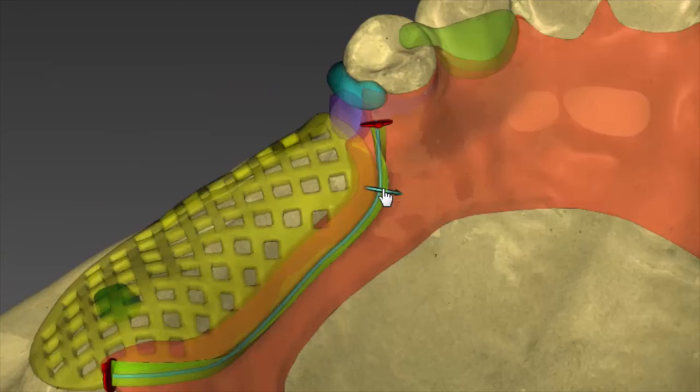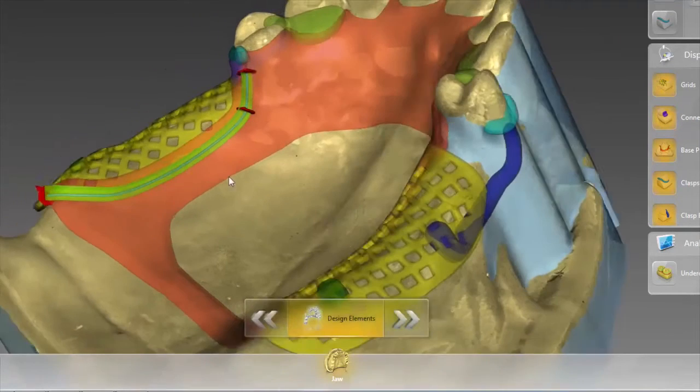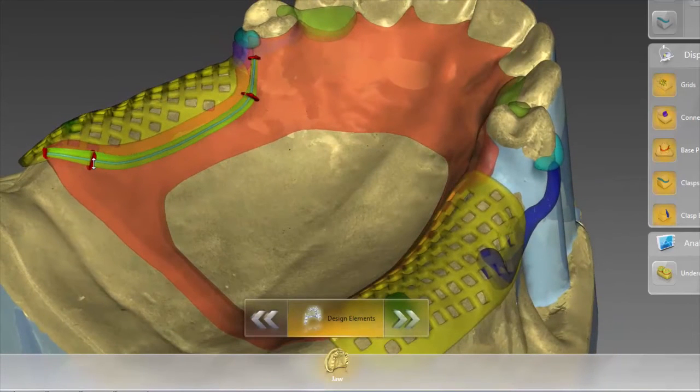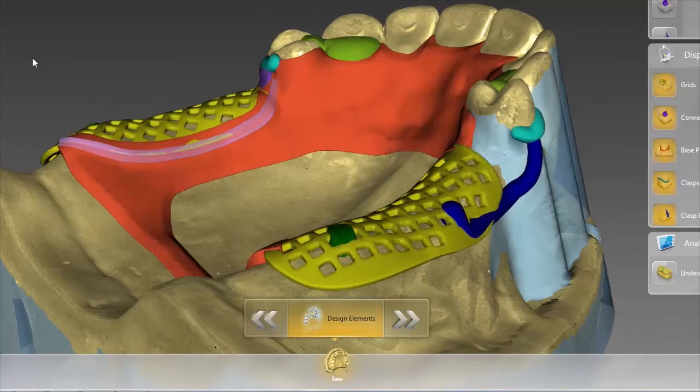So if I put another one here, and then move this one, and I can move the other one the other way, and give it a little better flow. Now if I take the left mouse button and pull, I could actually taper the ends of it. Get it where I like it, select Add Finish Line.